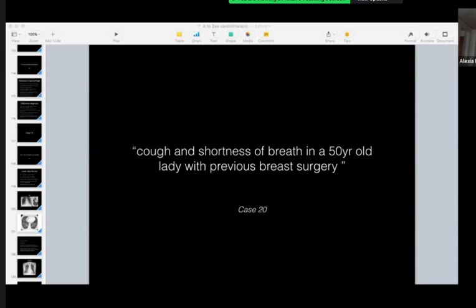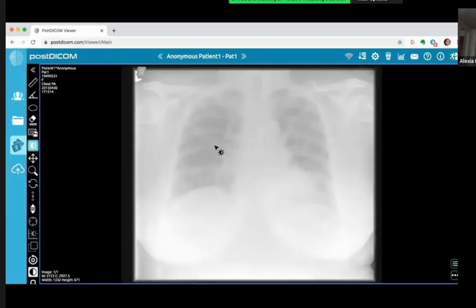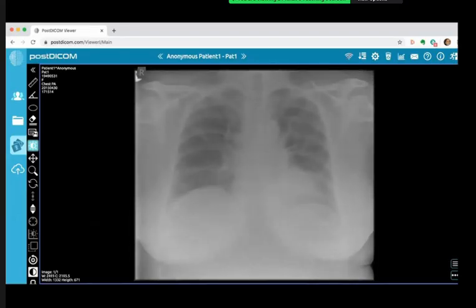So we'll start with the chest x-ray and then we'll move on to the CT. I'll window it for you because it doesn't project very well. Just talk through it, even if you don't see anything. I'll show you a CT in a bit, so don't worry too much.